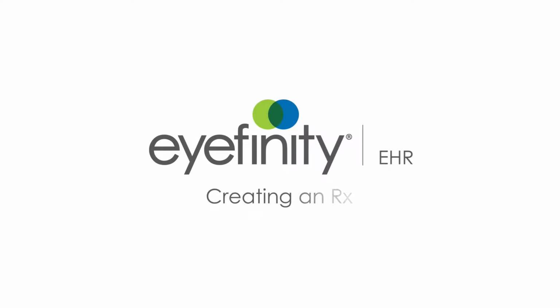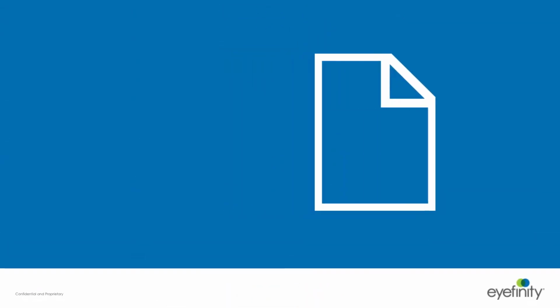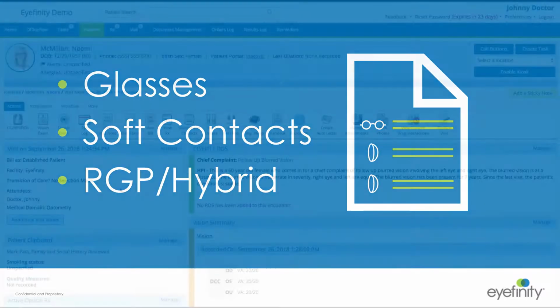Hello and welcome to this guide on creating an RX in Eyefinity EHR. In this video, we're actually going to create 3 RXs, one for glasses, one for soft contacts, and one for an RGP hybrid lens. Let's get started.